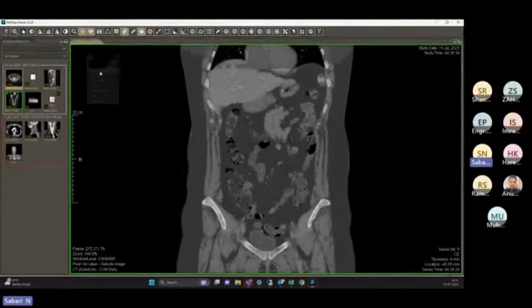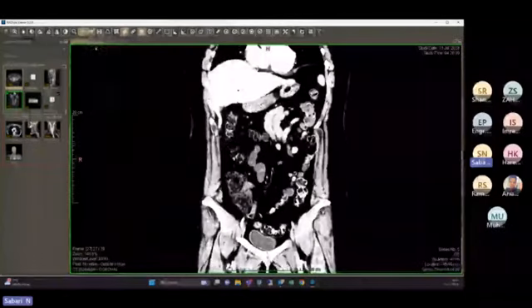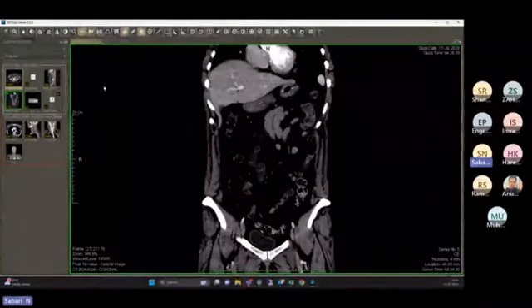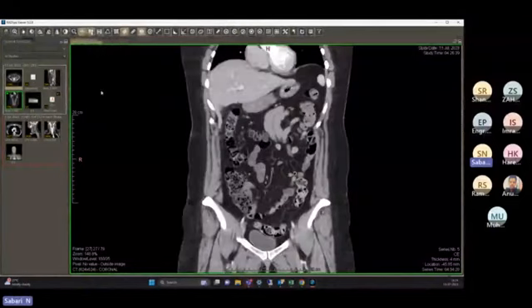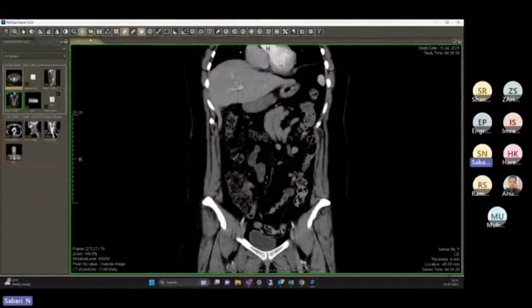Without this, none of the radiologists will do the report, because it is one of the main features of the presets. It's called window presets. So they can change the presets accordingly. If they want to add new ones additionally, yes, they can add them.